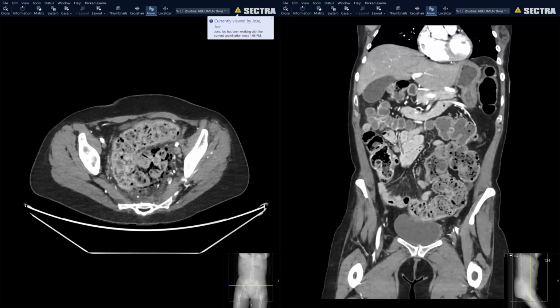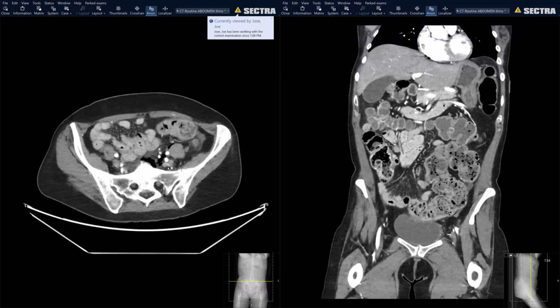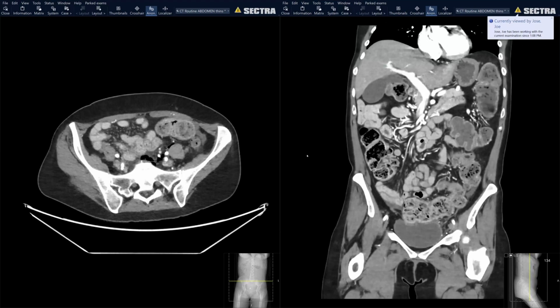Yeah, even the sigmoid, right? Sigmoid also, yeah. Okay. Thanks. All right.